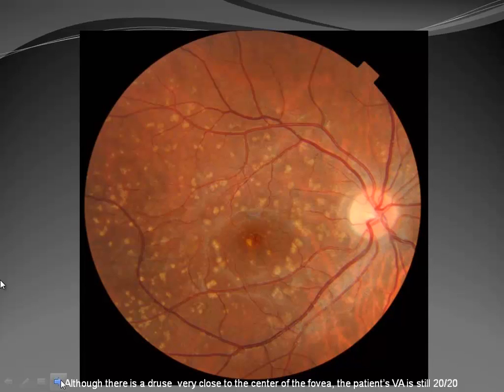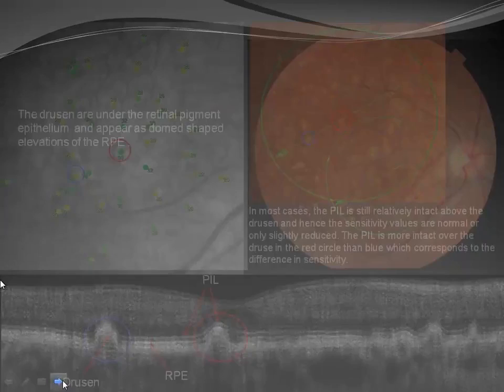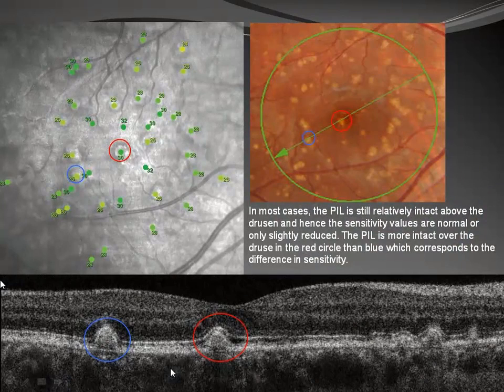This patient is 33 years of age. Interesting history, a drug addict, and she said she had terrible nutrition for 2 years. We're not sure if that relates at all, but she has a fundus that's filled with drusen. And we tested her sensitivity. We did put her through the Maia. So here we go. Let's go back. Here's a slice in this patient. So we dotted that drusen. We dotted all these drusen, as you can see, and we can actually measure the sensitivity.